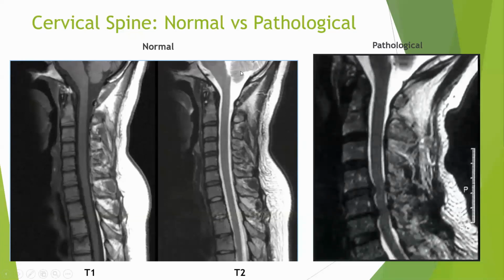From the book I have taken, it is saying this is normal. What are the two things you are seeing that make you feel maybe it is not perfectly normal? For me, there could be lots of interpretations. What you see, I may not see initially, and what I see, you may not see initially. What I saw initially is, look at the cervical lordosis. Can you see any proper normal curvature of the C-spine? I don't see any. What else do you see?